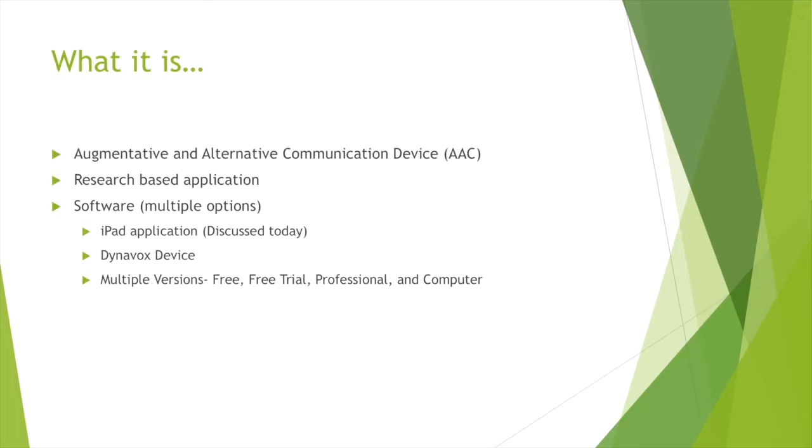What it is. The Tobii Dynavox Compass application is an augmentative and alternative communication device. It's a research-based application, and it has multiple options of software. iPad application, which will be discussed today throughout this presentation, which can be installed on any iPad or tablet Android device.